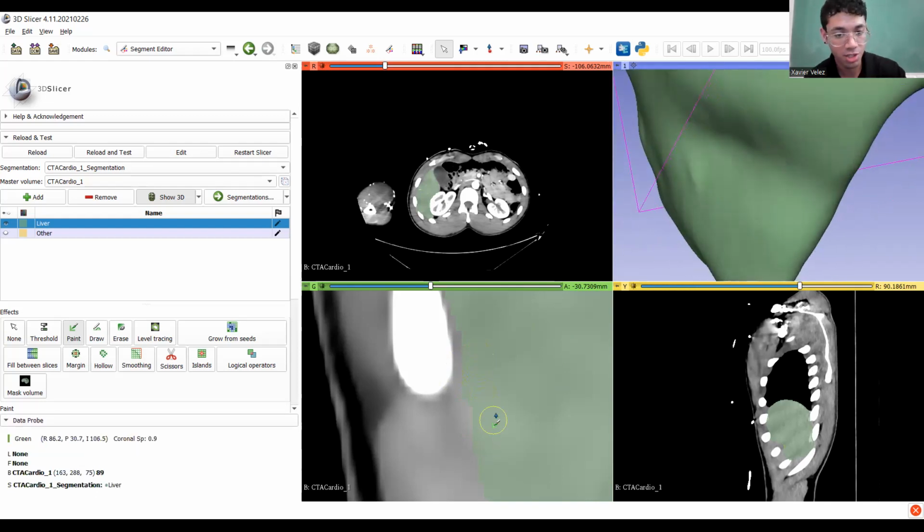Okay, so yeah, I'm just going to keep going. I'm just going to chug through. Again, this is one of those things where a lot of it will be trial and error, where you'll just have to figure out along the way what looks good and what doesn't.